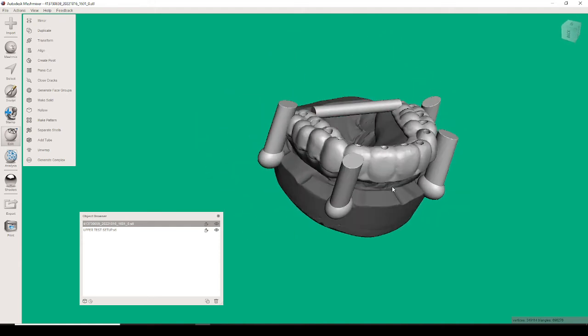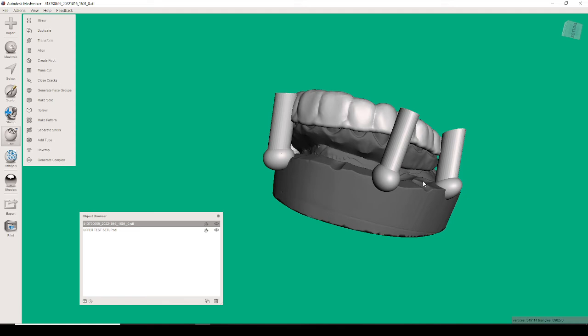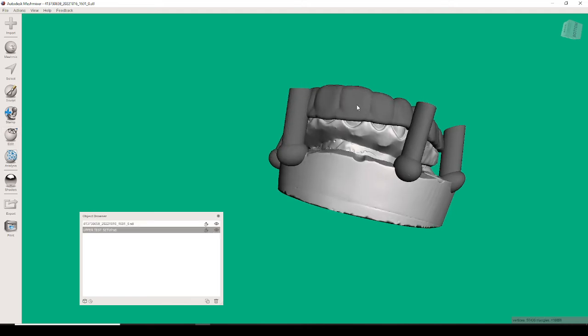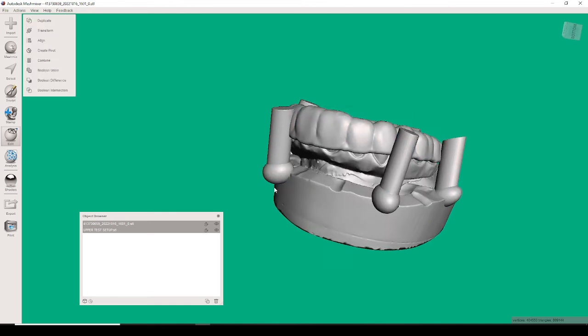So now we need to remove this model from this model so we have nice little cutouts on these legs so it can be positioned nice and exact to the model. But if I just select this one and this one and do a Boolean difference, you'll see that it's going to give me an error because these two things are connected too precisely, and it's going to cause issues in mesh, one separating from the other. But there's a really easy fix to this. Actually, I'm just going to press cancel because you see how this error will come out. So let's just press cancel.